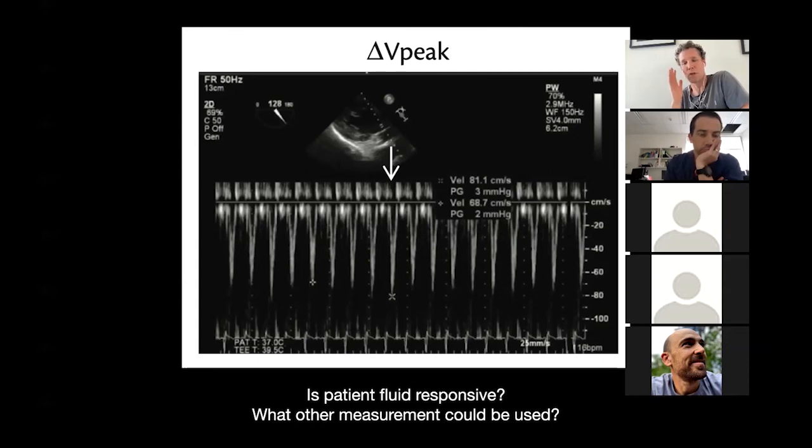Absolutely. So what measurement could you use to see if this patient is fluid responsive? SVC distensibility probably will be a better one. Yeah, well done. It's SVC distensibility. That's fantastic. And that, my man, is that.